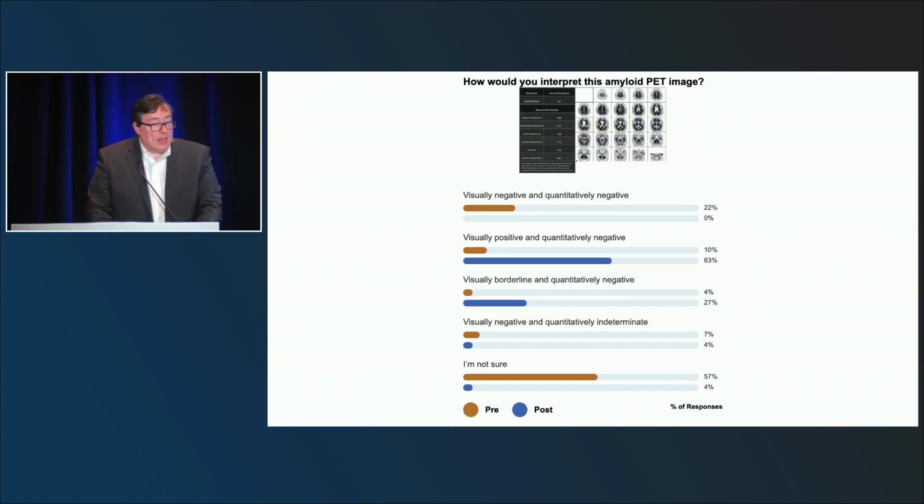And actually in the definition of most Centiloid calculations, the occipital cortex is not included, and so that's a common place where you can see amyloid deposition that doesn't count towards the Centiloids. And here a clue that the quantitation is falsely negative, in the sense that this person does have abnormal amyloid, is the elevated precuneus level.